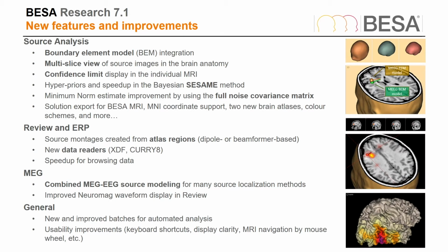Welcome to this introductory video about the highlights of our newly released BESA Research 7.1. We will walk through some typical scenarios hands-on to show the benefits that can make life easier and maybe give you new insights into your data.